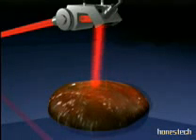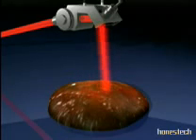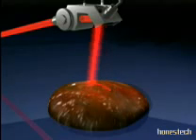The AcuBlade is a device that allows the beam to travel as a linear or curved line with an angular movement at the work area. Various lengths ranging 0.3 to 5 millimeters and penetration depths ranging 0.2 to 2 millimeters are programmable. A left curved line and a right curved line are available.